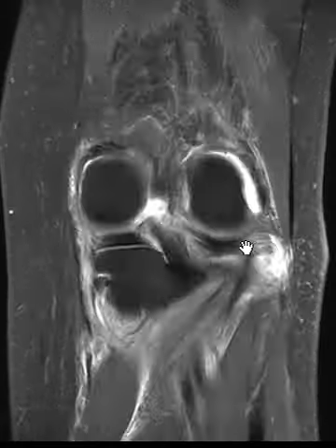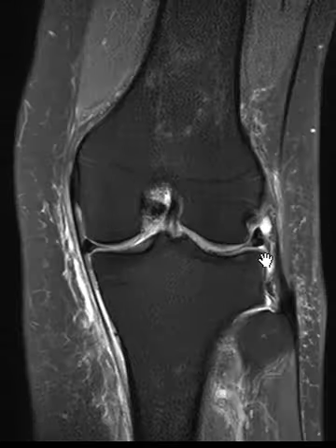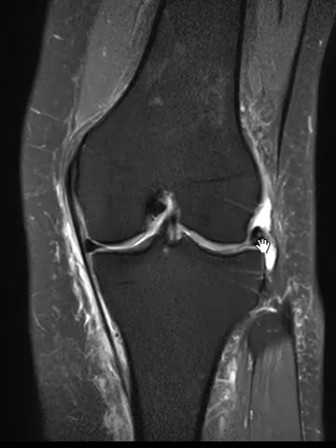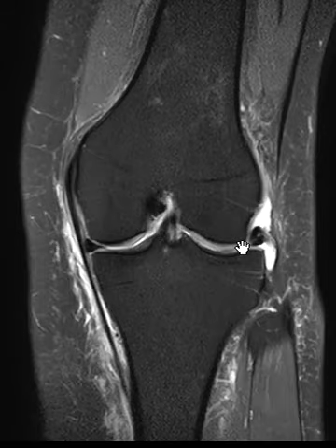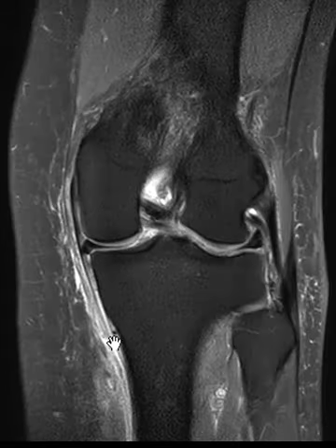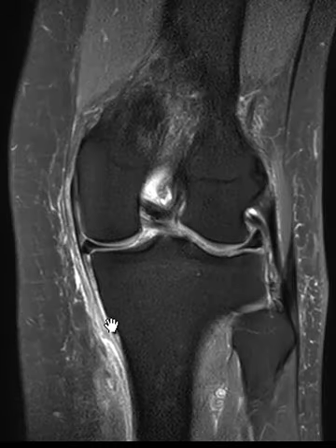So this patient had two findings: a partial tear of the semimembranosus tendon and a tear of the lateral meniscus root, and pseudo-extrusion of the meniscus, and a tear of the inner free margin of the meniscus body, and several other findings here. Partial tear of the distal attachment of the medial collateral ligament, a little edema underneath there.